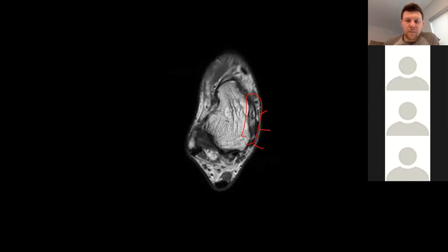Would it be like a bursa or something? Not a bursa, something anatomically that's going to hold the bones together. Oh, a ligament? Yeah, which one would that be over here? That'd be your deltoid ligament.